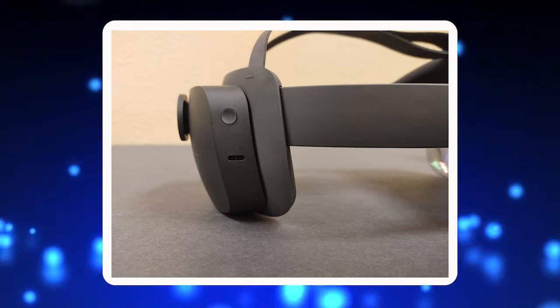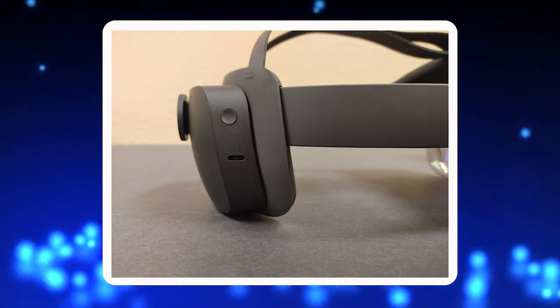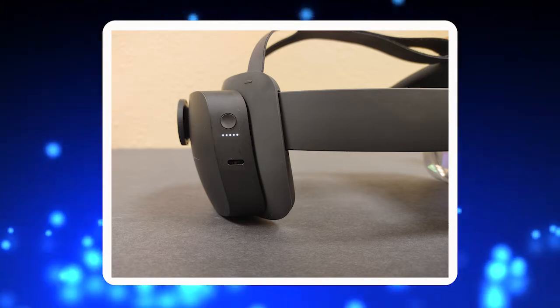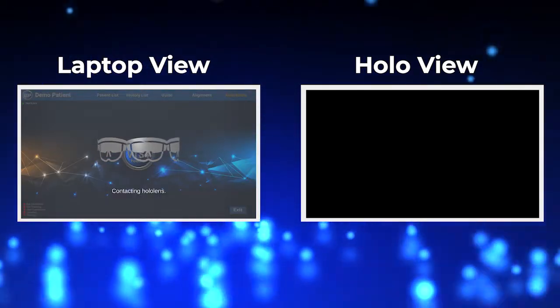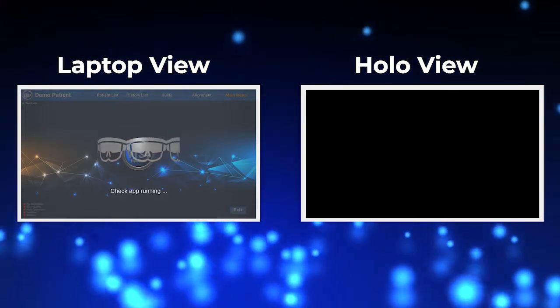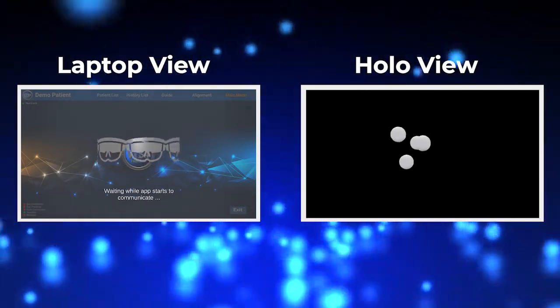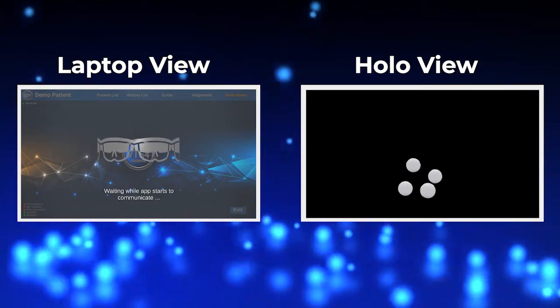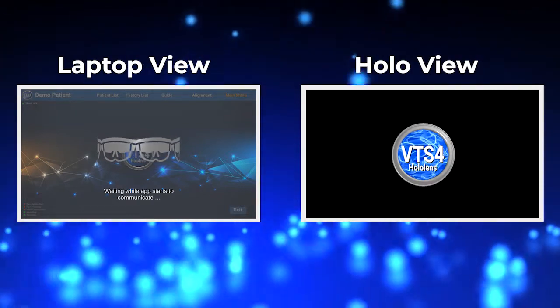Look at the back of the HoloLens for the power button and status lights. If the lights are not on, press the power button. If the status lights are on, you may proceed without pressing the power button. After clicking continue, the VTS4 will establish a connection with the HoloLens. This may take several seconds. When the connection is established, the loading animation will stop and the VTS4 is now ready to be used.